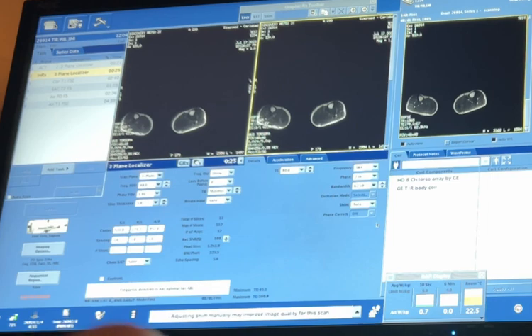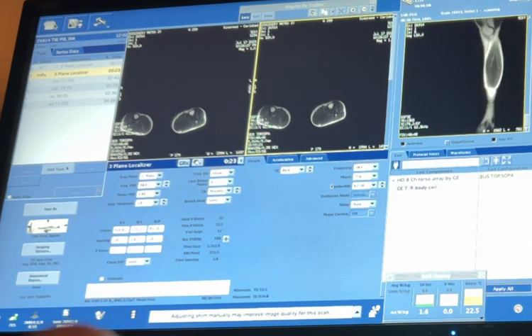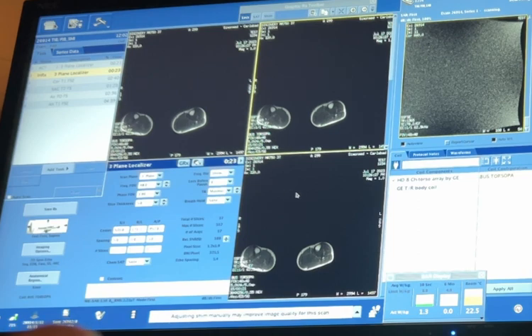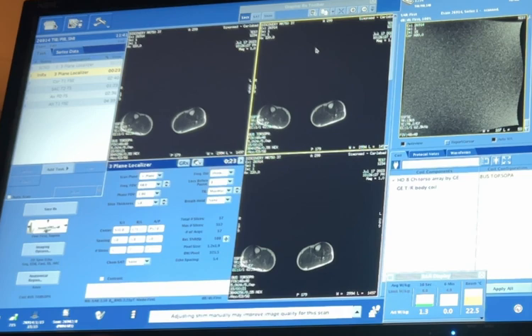Okay, so let's open up our axial. I'll have to click on it. Yeah, actually, and then apply all. Might as well do that. Okay. So we have our sagittal. So why don't you scroll through the sagittal? Is it the middle click or left click? Middle click. Okay. And then you're probably gonna have to.